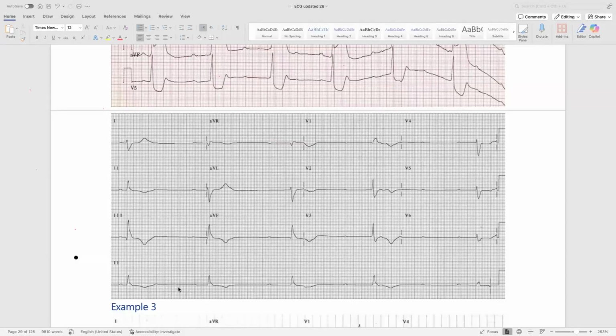Okay, drop. Prolonged PR, very prolonged. Too much prolonged. And drop. Is it a Wenckebach? No. Wenckebach will never cause too much delay like this, too severe bradycardia like this. So the one which looks like a Wenckebach in a severe bradycardia is actually complete heart block.